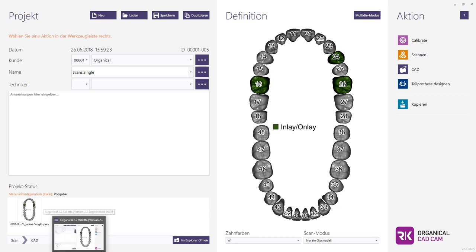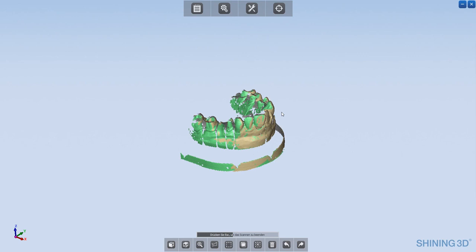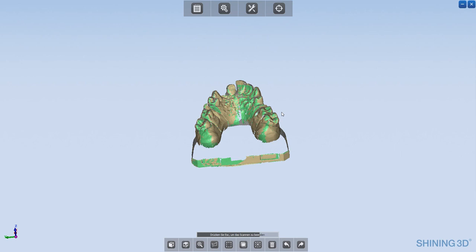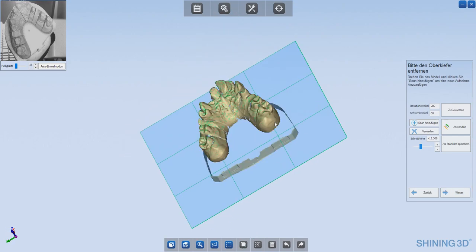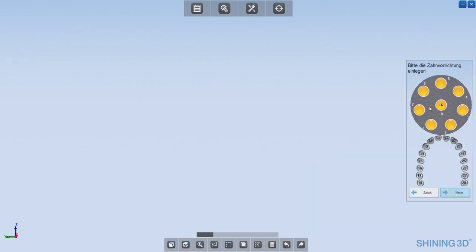So as you see right now at the scan itself, it's not inlays, they are stumps. And when I have very problematic stumps like undercuts or something like that, or they are too big, sometimes the single stumps are too big for the hole. You can't get them inside, and if they contact each other, you have a problem because you must separate them. For this, I don't care about the separation of the single scans, I make it this way. I say this one is an inlay.